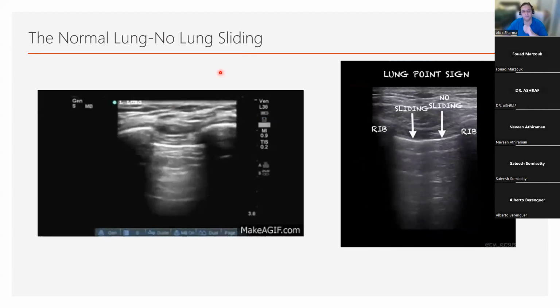So we have collapse, atelectasis. Beautiful. Complete collapse, lack of lung aeration. You won't see the pleura actually, and I will show it to you today, because there's no air going into that area of the lung. If there's no air going into the lung, you can't see. So complete collapse, atelectasis. What else? Pneumonia, severe pneumonia. Severe RDS.